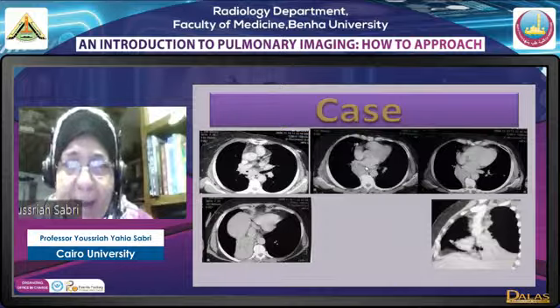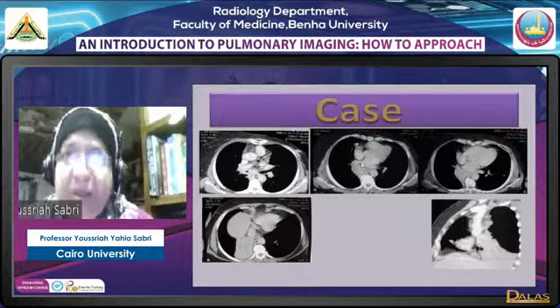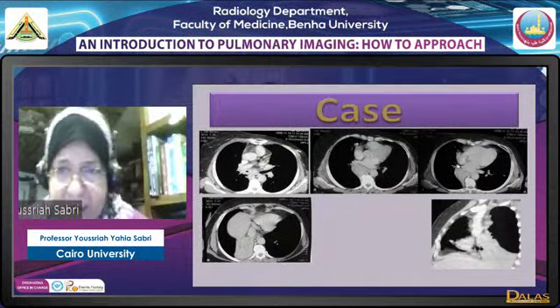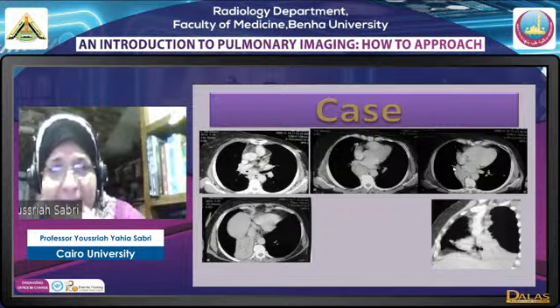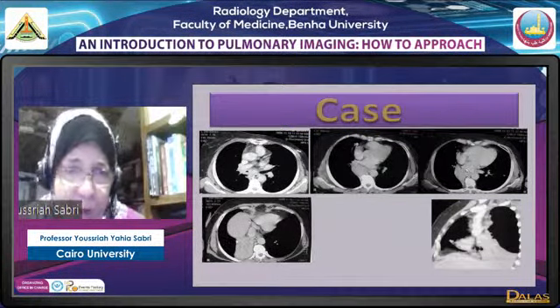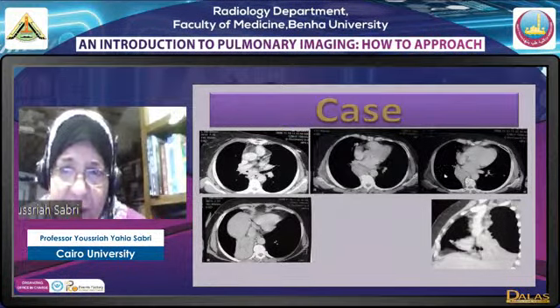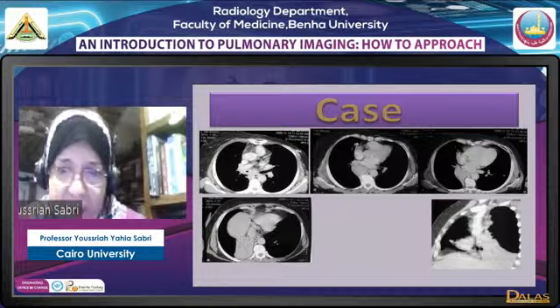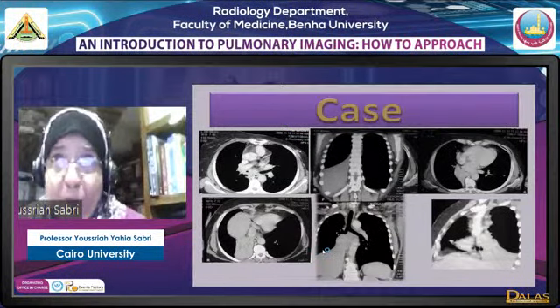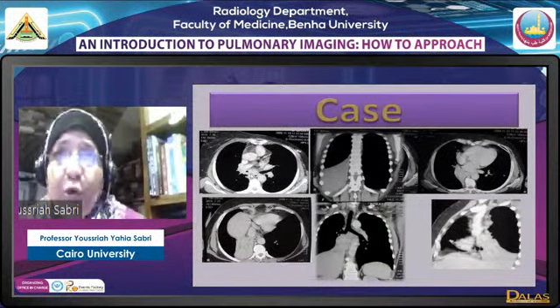Okay, are we only dealing with a mediastinal problem here, or is there another associated problem? If you go through it, you will find that this lesion in the posterior mediastinum is extending to join another lesion in the lung, and they both amalgamated together actually, and they have a well-defined curvilinear margin. Having a well-defined curvilinear margin and then joining the lower lobe, meaning we have a total lower lobe collapse. No aeration whatsoever. This collapse is due to obstruction.